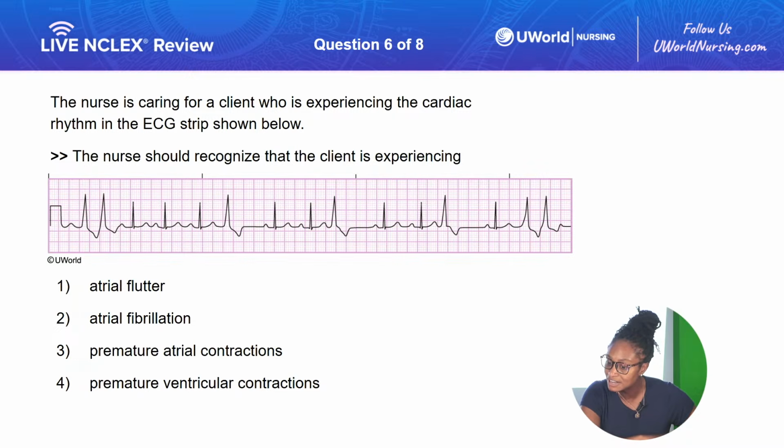Abu Dhabi, Ghana. Someone asked, do you count the PVCs in the rate? Actually, you do not count PVCs. This is PVCs, premature ventricular contractions. You do not count PVCs in the rate necessarily because it doesn't have the full complex of a P and a QRS wave in it. So you just count the ventricular rate because usually ventricular rate or QRS has an adequate P wave with it. But yes, with this question, the correct answer is premature ventricular contraction.